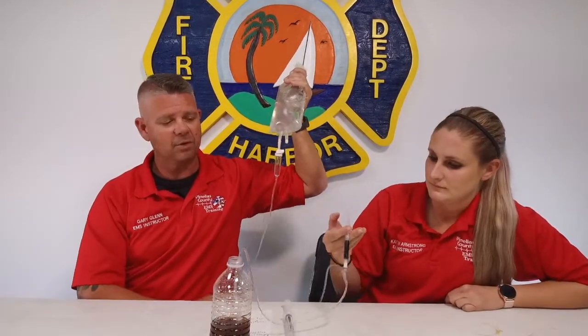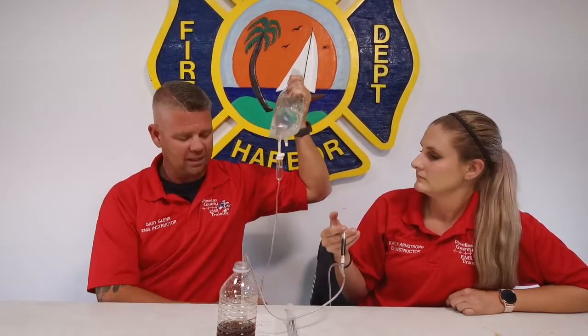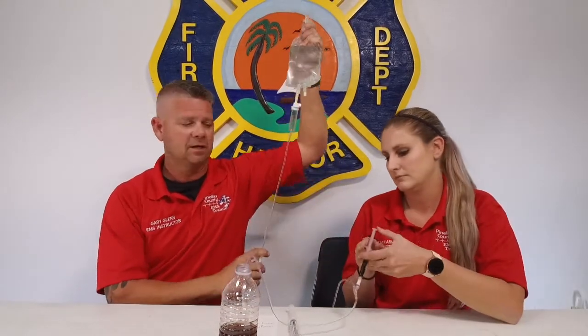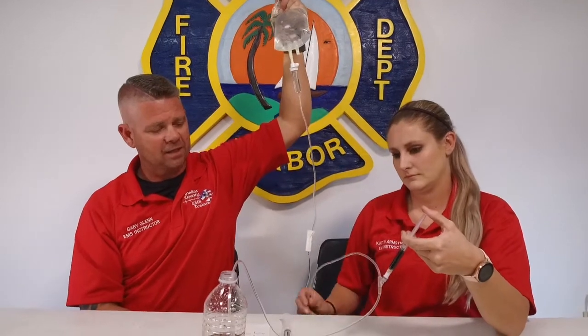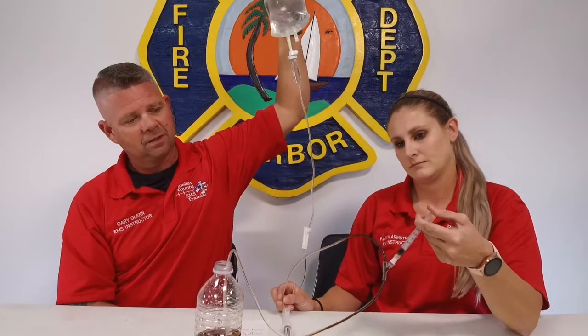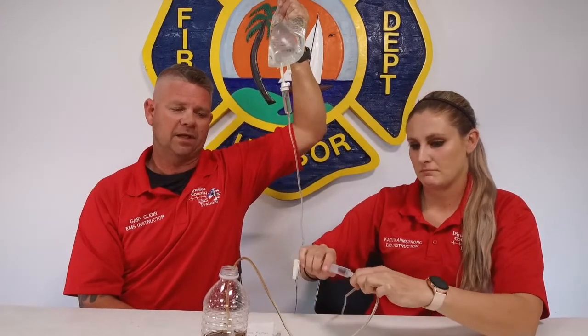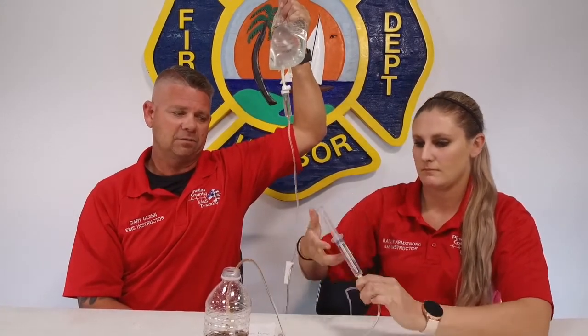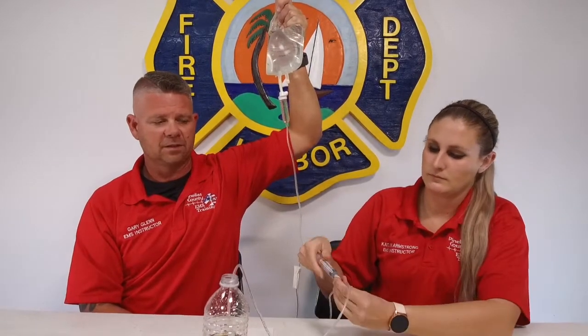So we want to see, hey, if we give this medication and someone's squeezing the bag and we got it wide open, we got a 20 gauge AC or higher, are we going to get any backflow on this IV line, okay? So I got the IV wide open, I'm squeezing the bag, Caitlin's going to give the medication, rapid IV push. Oh, okay, so it looks like we had a little bit of a backflow into the line. So that could be an issue. So now she's going to give the 10 cc flush real fast.